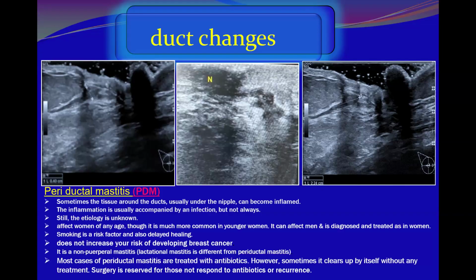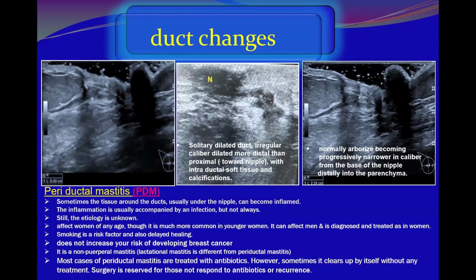There is something tortuous, and the surrounding tissue is distorted. There is edema, there is skin thickening, there is no delineation, and a complete lack of differentiation in the adjacent tissue. If you go down, you might find a mass or something, and even if it is a solitary duct, this is per se suspicious.